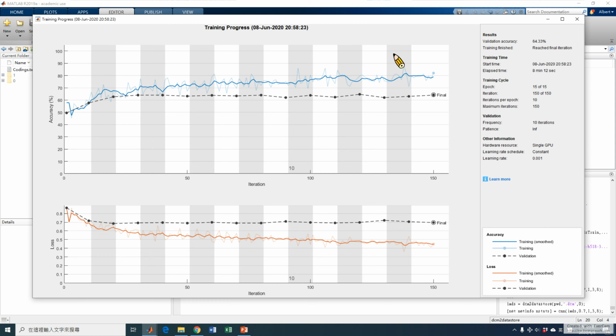So that's a kind of overfitting, and there are many reasons for overfitting. One of the reasons may be that the resized images don't work, or we also need more features to learn the data, and probably the features we capture in the CNN model don't work on the validation data, so you see the overfitting in this case.